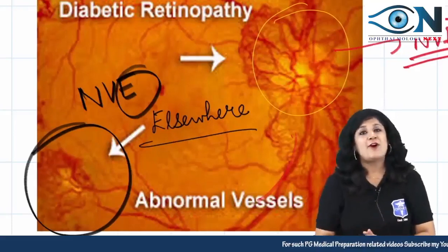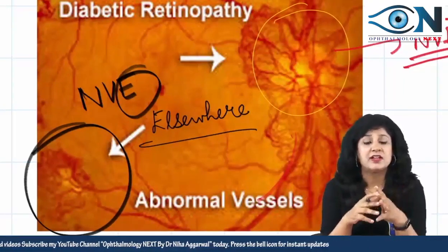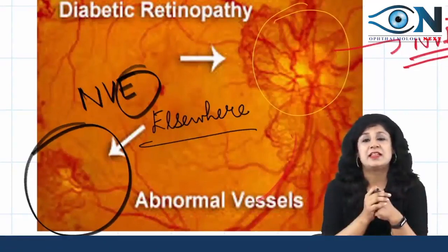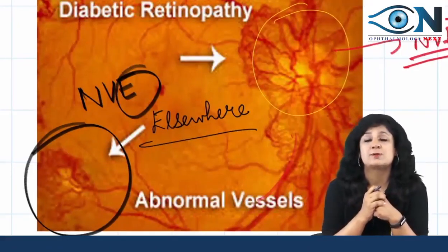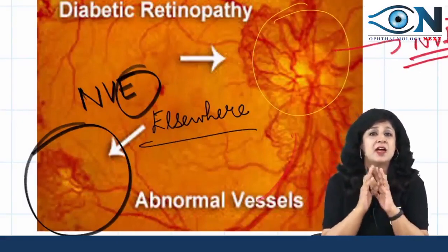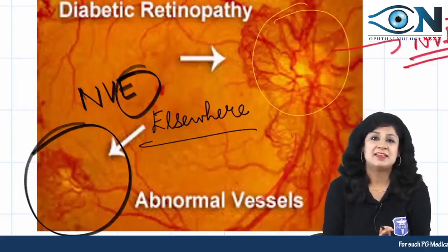So I think that's all for today's session. Today we have learned some of the important details of the fundus. What is the fundus? What is the normal anatomy of the fundus? The central retina, the peripheral retina, the layers of the retina, then how to find out certain important pathologies, what are cherry red spots, splash tomato appearance, their differential diagnoses, the difference between CRAO and CRVO, and amongst all, most important, how to differentiate and diagnose hypertensive retinopathy and diabetic retinopathy.